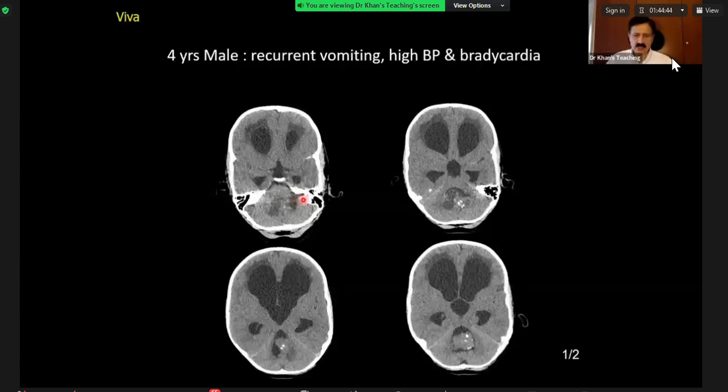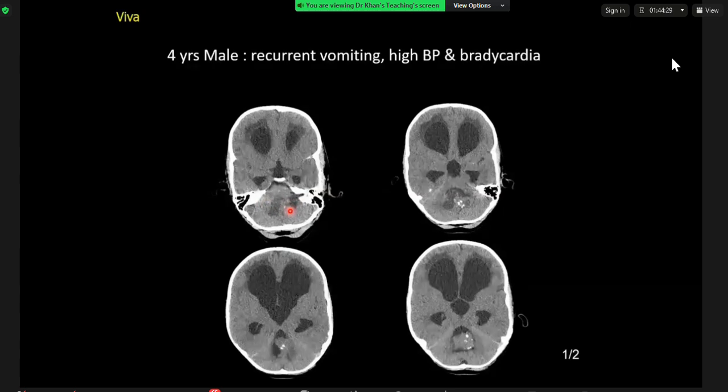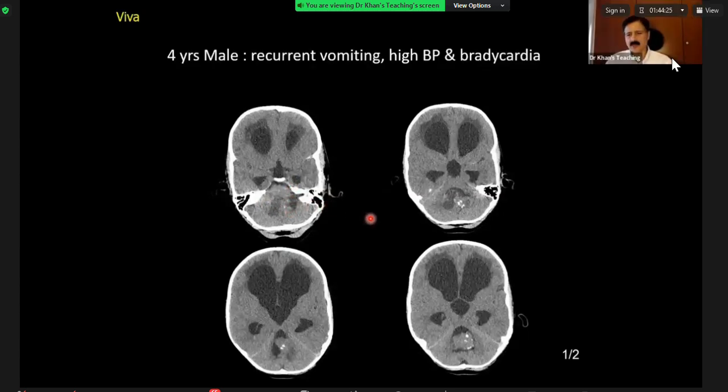What do you think is happening here? Anatomy wise, where are we? Do you see this IAM here? Yes, yeah. So do you see this potential connection between this? And there is no connection. There should be no connection. Are you with me now? Yes, yeah, I'm with you. So with this hint, what comes to your mind?